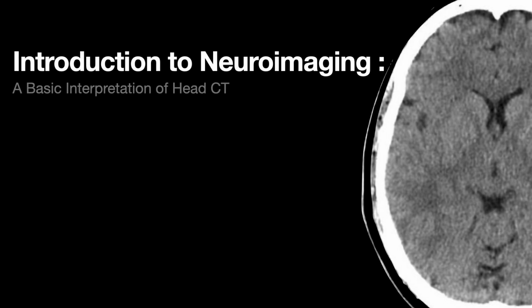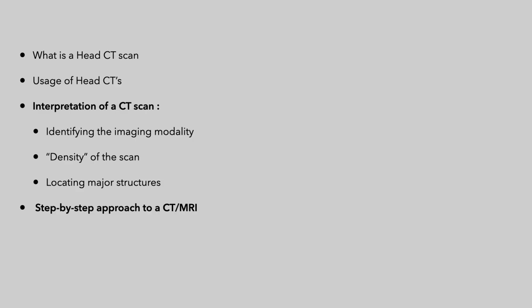Hello, everybody. Today we're going to talk about an introduction to neuroimaging, a basic interpretation of a head CT. This video is meant for medical students or young residents or anybody really who's keen on knowing neuroimaging. It's not meant to be a long video. It's just taking bits and pieces of the important stuff to have a layout of what a brain CT should look like.